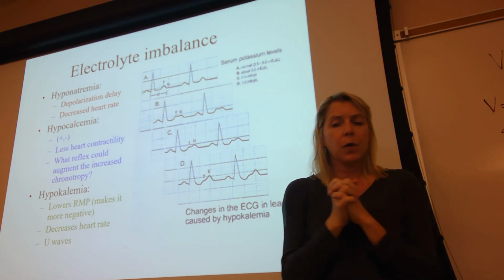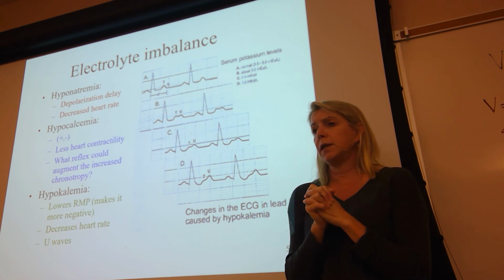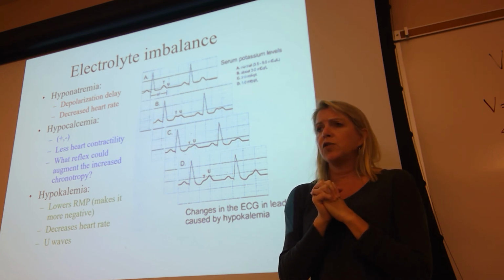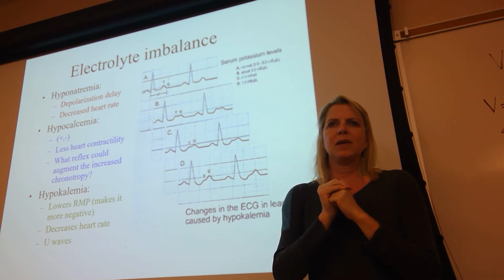Okay? Okay. Can you please, real quickly, get out your EKG, find your TP segment, and calculate your TP segment in time.